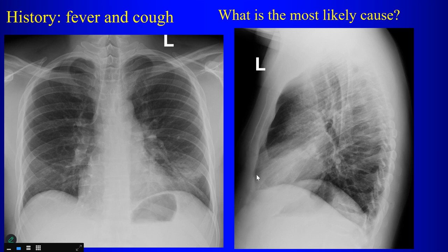So where would that be then? That would be in the... well, this part of the lung is the lingula. Right, so this patient has pneumonia in the lingula.